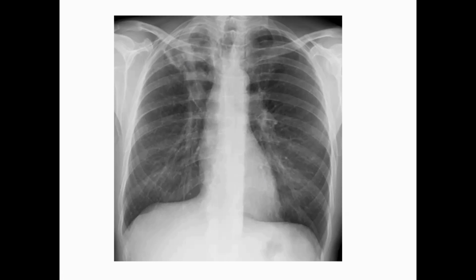So here, for sure, you are not 100% sure this is TB. You are not going to say, oh, it's TB. No, you will just interpret it as heterogeneous opacity in the right apical zone. Features could be of pneumonia, or TB cannot be excluded. Why? Because these are typical location and features of reactivation or secondary TB.